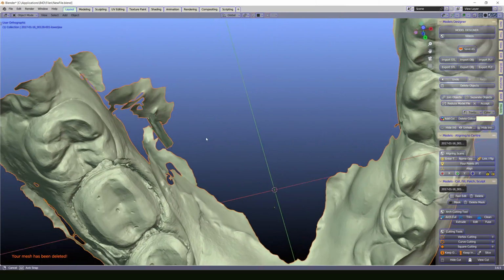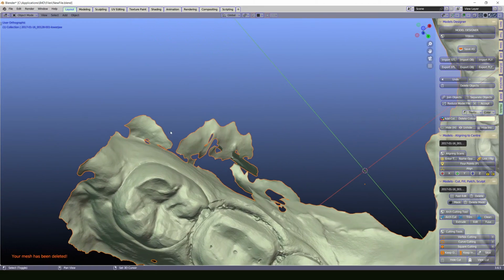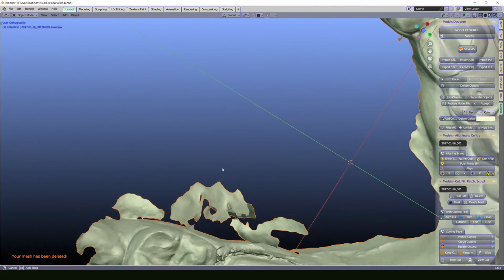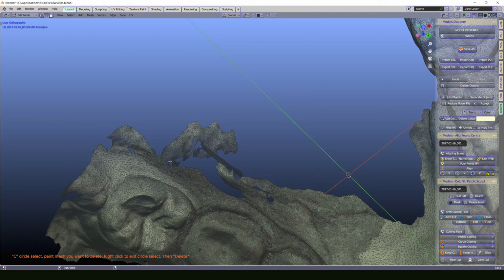And I check if they are connected. Yes, they are connected. I choose to make markings from this side. I push the shift button to drag around the file. I position it so it would be more comfortable for me to mark it. And I go again, select the file, and I go to fast edit. I push the C on my keyboard. I mark that area, and I push the right mouse button on a clear space, and I choose delete.